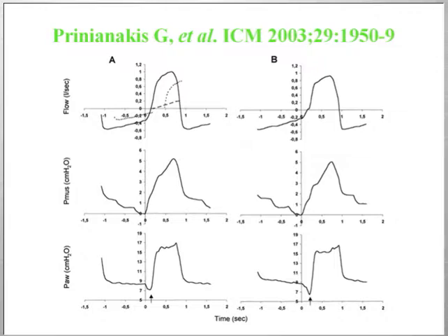And with this new sophisticated system shown here under the heading A, the machine offsets and delays the actual flow signal, which is this black tracing. By offsetting and delaying this flow signal, the machine generates another electronic signal, which is this dotted line, which crosses the actual expiratory flow, and this is used to trigger the machine, either this one or the usual inspiratory flow setting, whichever comes first.